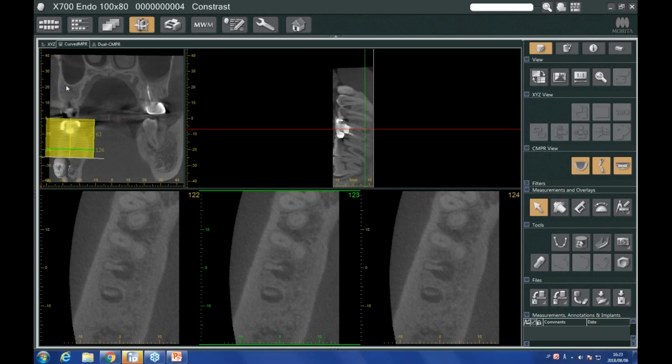If I was focused on just dental arch view, then I wouldn't necessarily consider looking at it in this way. So what I want to encourage all of you to do when you're working with cone beam imagery and software that gives you this kind of freedom is to really make use of that, to make sure that you can see a tooth from every conceivable angle, because that is the power of 3D imaging.